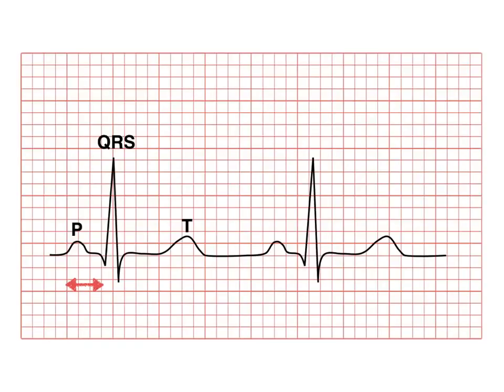Because again, aside from sinus rhythm, AFib, or A-flutter, the three AV blocks are really fair game, so you're probably going to be asked a question on them. And that's why they're high yield, and that's why we're going over them today. So before we go into the AV blocks, here is normal.